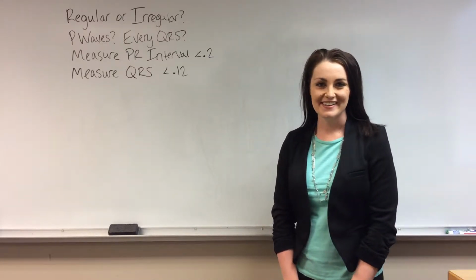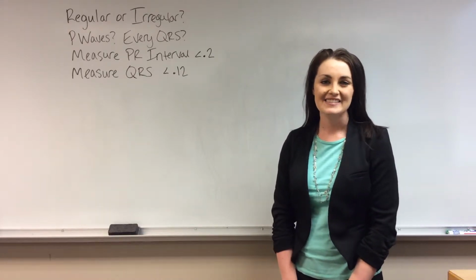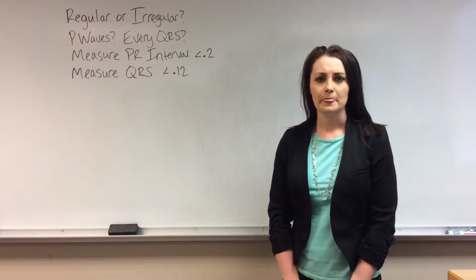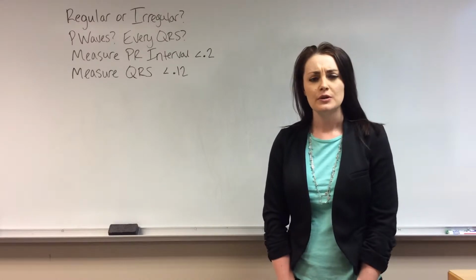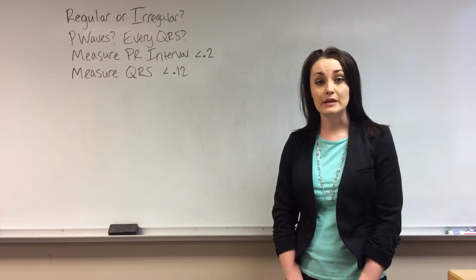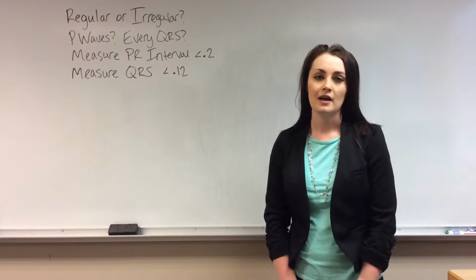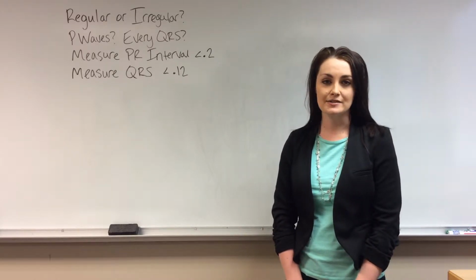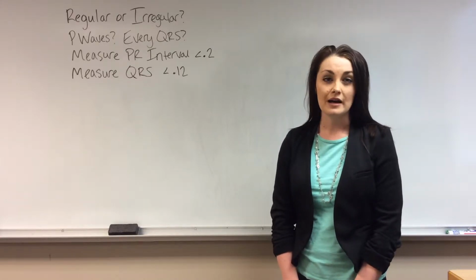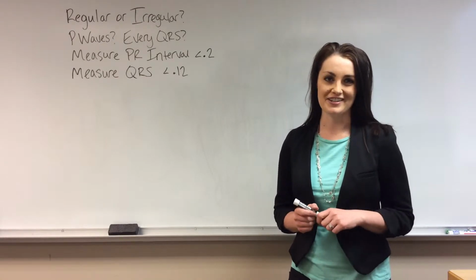So this is the third and final video of the rhythm analysis videos. In the first two, I've talked about the different sinus rhythms, atrial dysrhythmias, and junctional rhythms, and now I'm going to start to talk about the ventricular dysrhythmias, as well as asystole and pulseless electrical activity. I'll briefly touch on pacers and how they're depicted on the EKG strips, and then also talk briefly about premature atrial contractions and premature ventricular contractions.